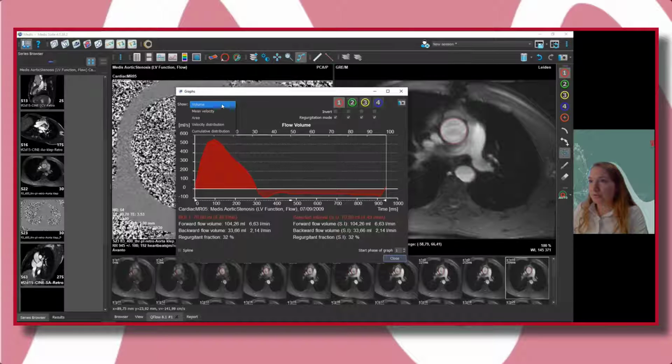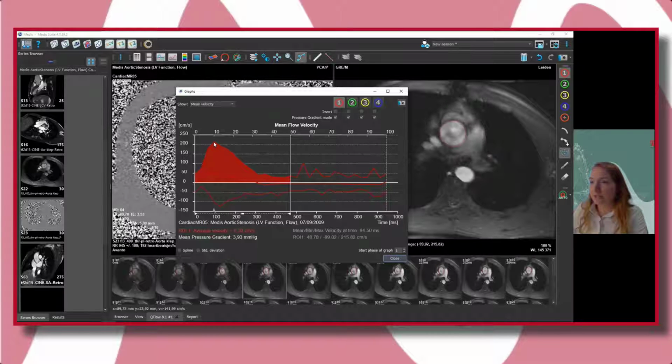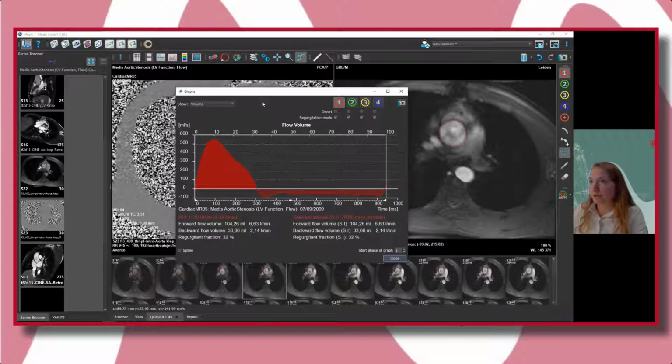Besides the volume analysis, the velocity will also be measured. Here you see three graphs: the max, the mean, and the minimum velocity in this area. If we click on the highest velocity, you will see which values are involved. The mean, the minimum, and the maximum velocity will then be displayed here below. If you want to add any of those graphs to the report, we can click here on the snapshot button in the top. We also want to do that for the volume curve.